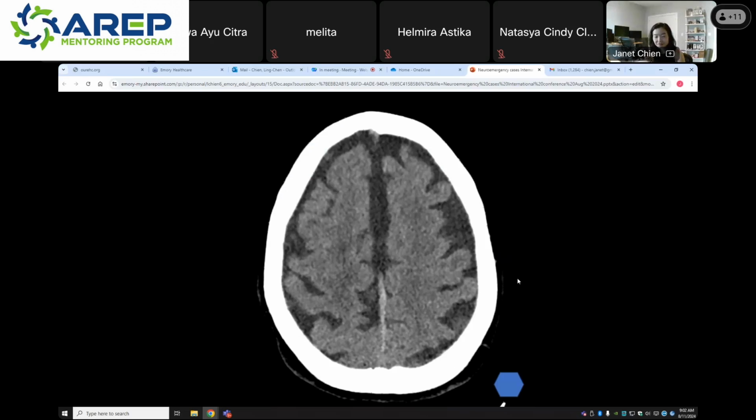Anyone? Anyone knows what this finding is?